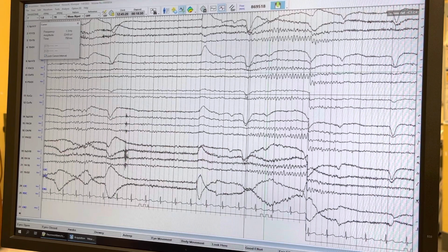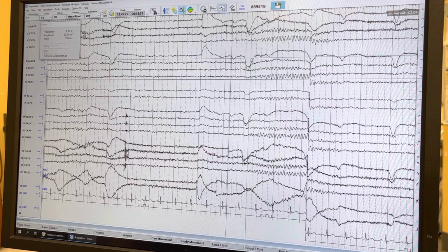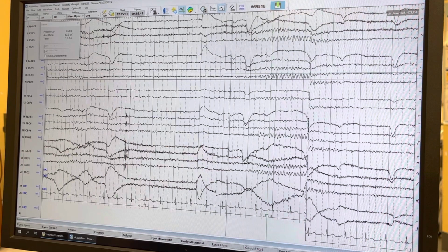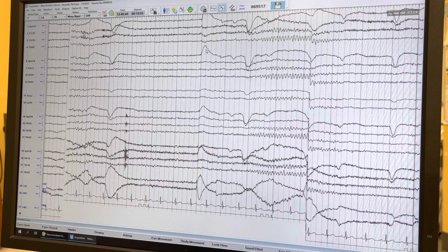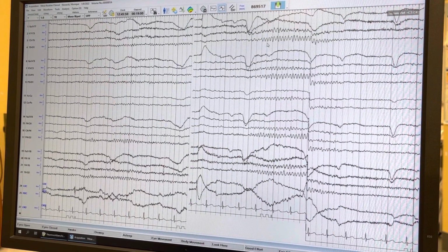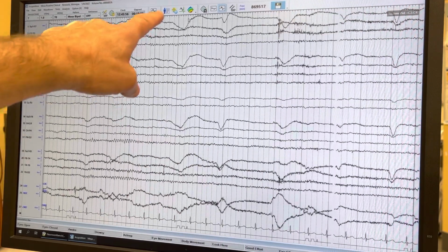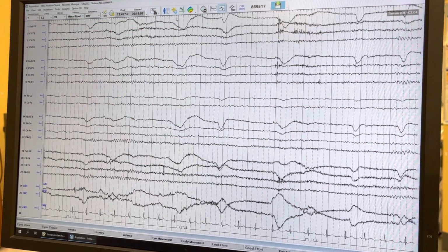Okay, if we lock it, let's see. Okay, let's unlock it. Oh, there we go. And then we've got to bring this over to right there. Yeah, I don't know. We'll have to play around with this. Sorry about that, guys. Okay, so you see when I shut it off, it was recording in the background, but if you want to measure the amplitude and frequency of an individual waveform, you just click this one right there. But we'll have to learn how to use that one.